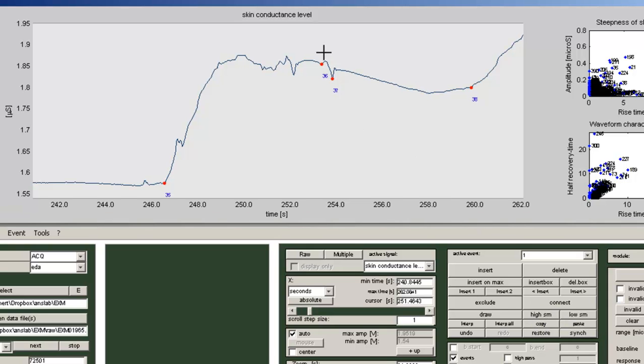High smoothing, for example, means that within that box the signal will be smoothed, which is of relevance to the skin conductance level that is also calculated independent of the fluctuations. So smoothing can be used with respect to skin conductance level, but still those fluctuations need to be removed. Let's do a bit more smoothing here. And this looks fine.